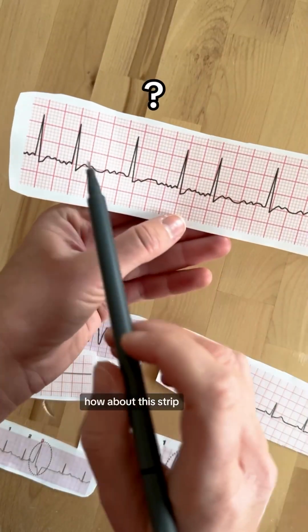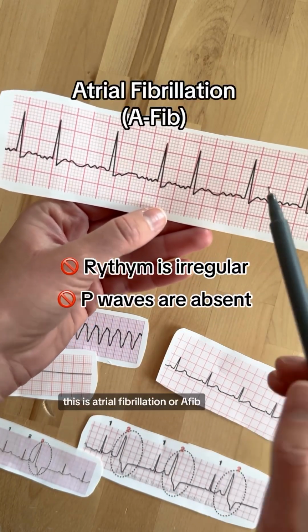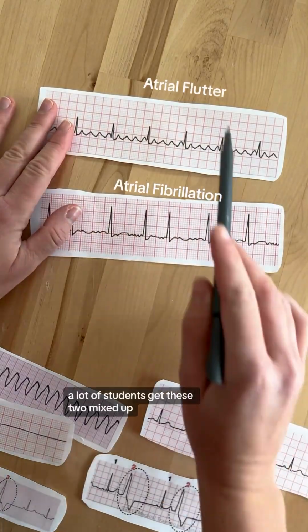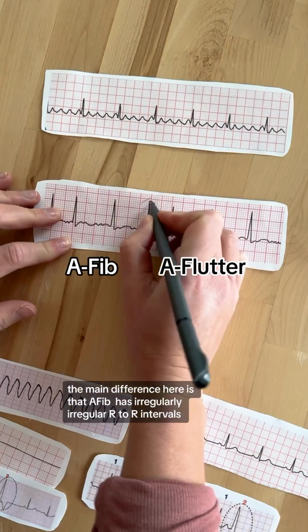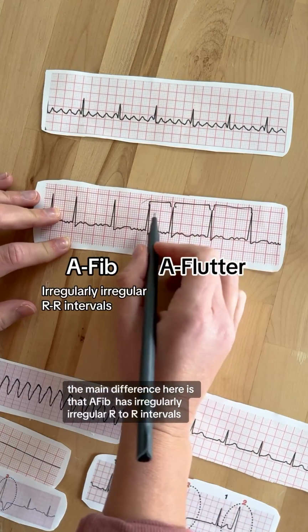How about this strip? The rhythm is irregular and the P waves are absent. This is atrial fibrillation or AFib. A lot of students get these two mixed up, so I'm going to tell you how you can notice the difference between atrial flutter and AFib. The main difference here is that AFib has irregularly irregular R-to-R intervals.